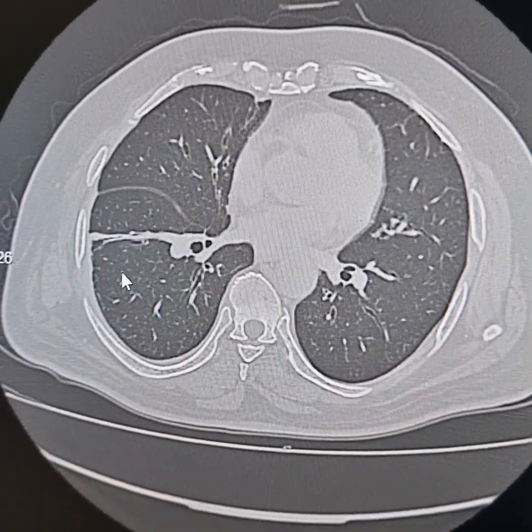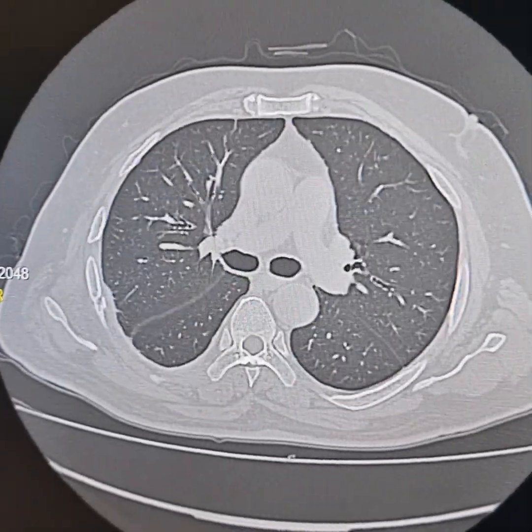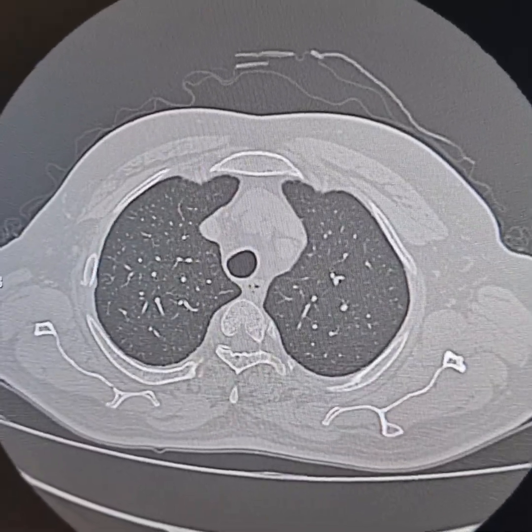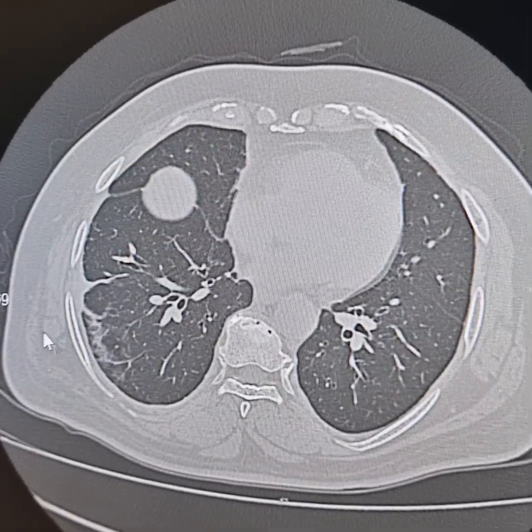Now these are the pulmonary contusions here, atelectatic bands and pulmonary contusions on right side. These are the pulmonary contusions here.